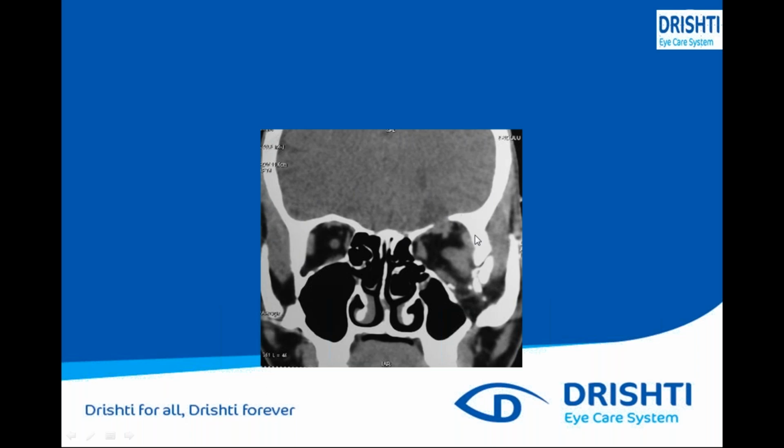You always need to compare with the other normal eye. If both eyes are involved, you can compare the parts. Suppose in this area the frontal bone has been damaged, then this area is normal. In that case, you should compare with the other normal parts of the body. So the fracture is easily visible.